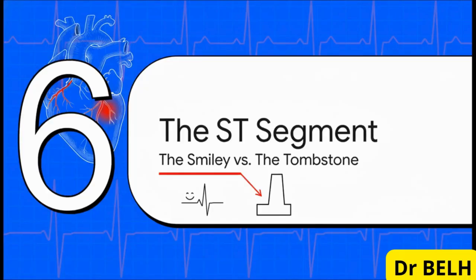Okay, everybody take a deep breath. We have arrived at the most critical, the most time-sensitive part of the entire ECG, the ST segment. This little piece of the line tells us if the heart muscle is actively being damaged from a lack of oxygen. In other words, a heart attack. This is where you can truly be a hero.